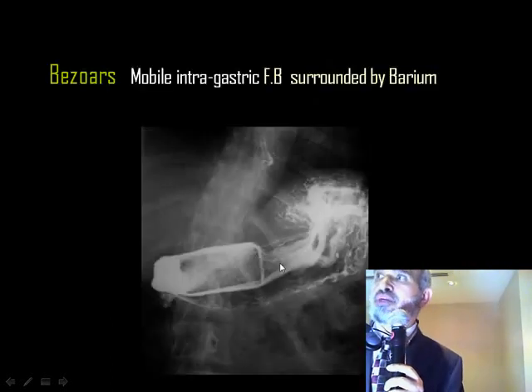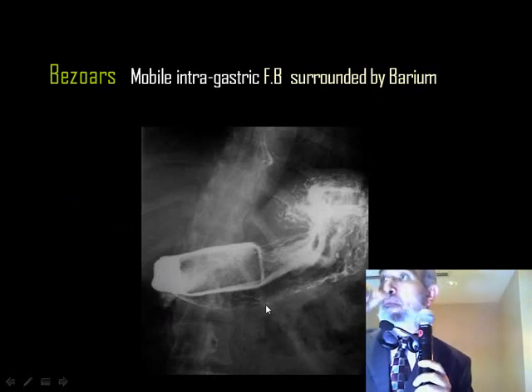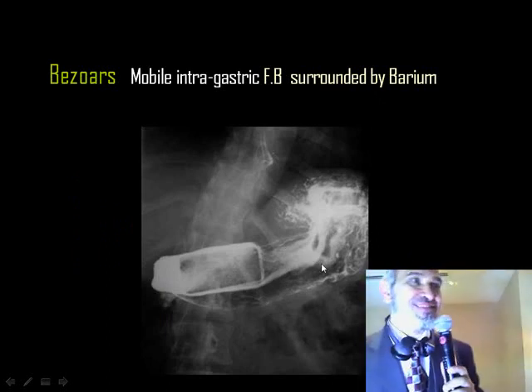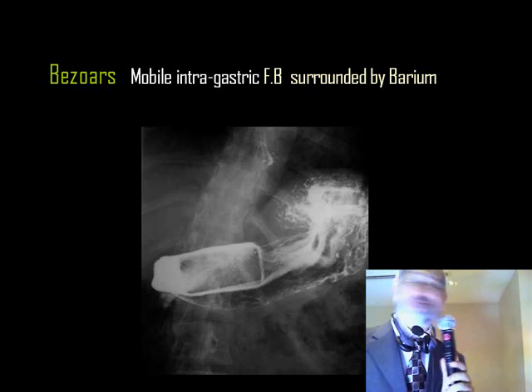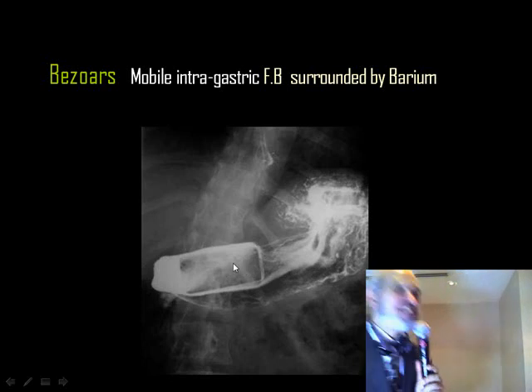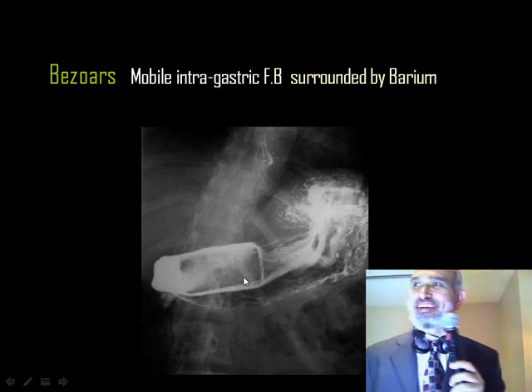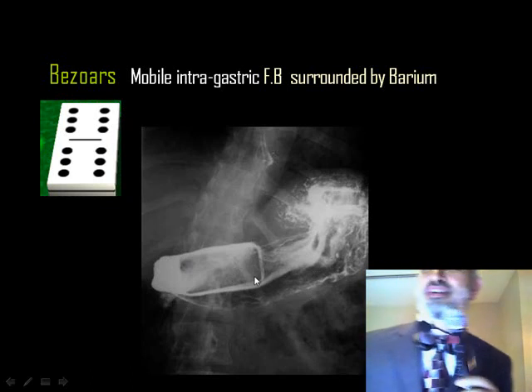Then can you predict which foreign body has been swallowed by this patient? Sorry? Bottle of A. Some kind of tablet. It's a big tablet. Giant tablet. Mobile. Yes, good idea. But you can see some of the machines inside the mobile. Okay. This is the swallowed thing.